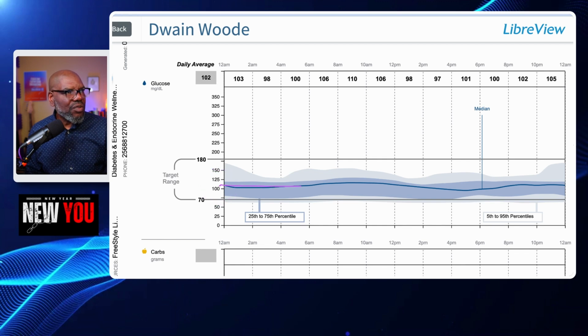That's what the average of those 14 days has been. Right, so I'm not doing a very good job of following the line, but that's okay. All right, and then it tells me what the 25th and 75th percentile are around that line. Right, so that's what the grayish part is.